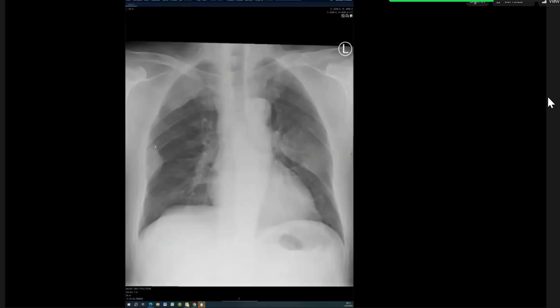The description was, if this was the only abnormality, I would buy the pleural based obtuse margin, etc. But here the bone destruction is quite clear. So I was looking for bilateral aggressive lesions causing bone destruction. I'm concerned for underlying malignancy, metastatic or primary bone. But after that, I think the CT obviously caught up very quickly.